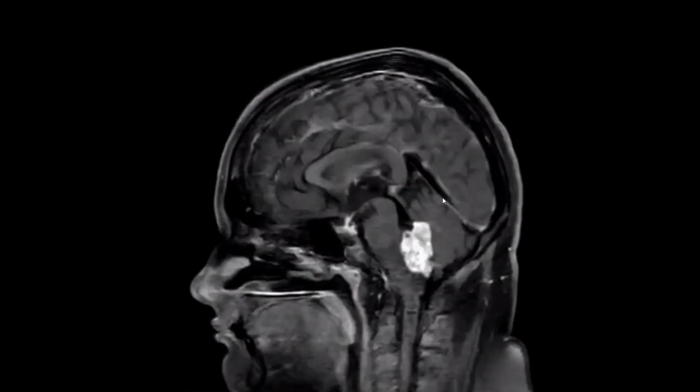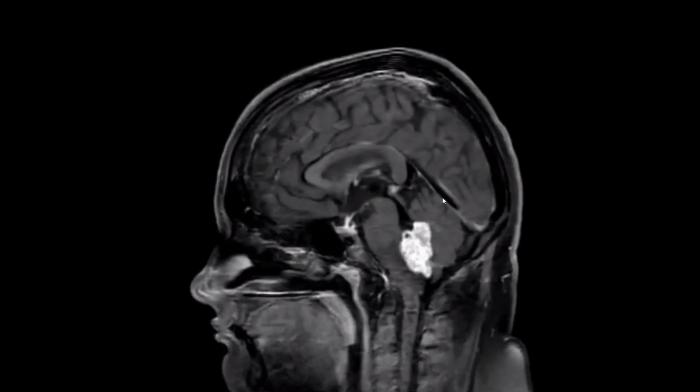Okay, so I want to put a differential diagnosis for this lesion. It's a lesion with mixed solid and cystic components within the fourth ventricle of an adult patient. There is also evidence of maybe calcification within the hypointense signal. Maybe this is ependymoma. The main diagnosis could be ependymoma.